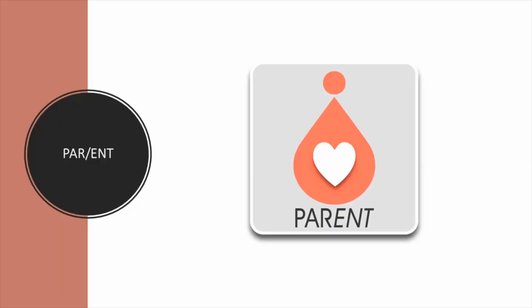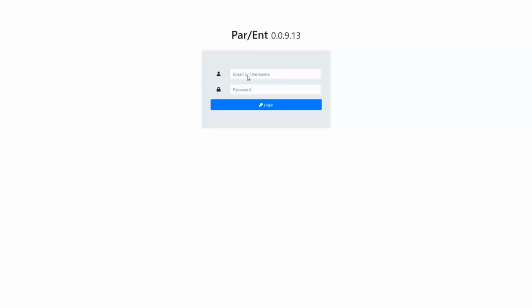We now present a short video of instruction on using the program ParEnt for the calculation of parenteral nutrition. This short tutorial is just about instruction in the use of the program, and has no scientific purpose of teaching parenteral nutrition. Let us start now with a brief introduction of how to use ParEnt for prescribing a pouch of parenteral nutrition.